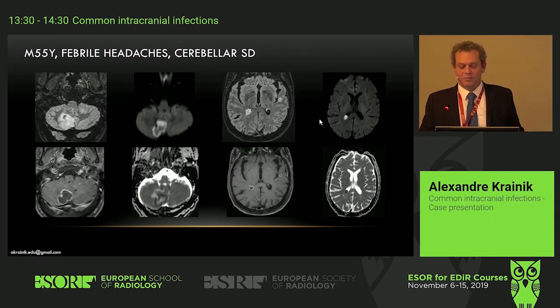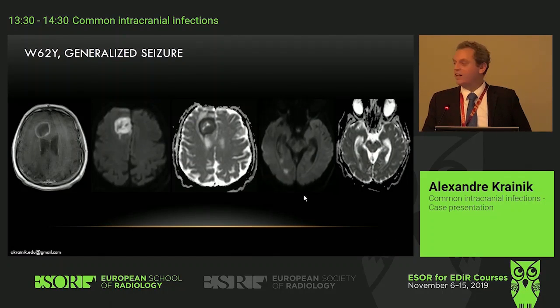Okay, then will be simple. It looks like abscess, huh? It looks like several abscesses. And actually, it was some abscess related to stent. Okay, other one.